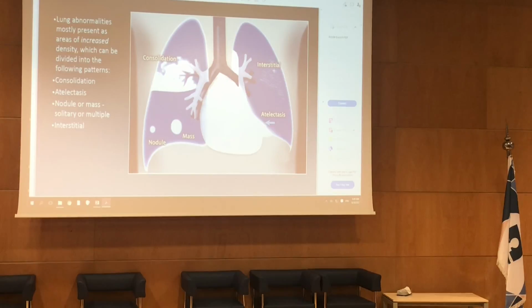What could it be also? Oh yeah, and also interstitial lung disease, right? Interstitial lung disease is an inflammatory process that destroys the lung, and there are many subtypes. Sometimes it's related to smoking, sometimes it has a genetic predilection. Anyways, it can get so severe, and we'll see a few cases, that the patient needs a lung transplant.